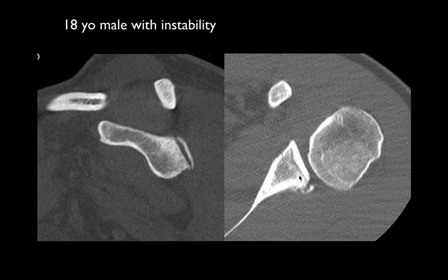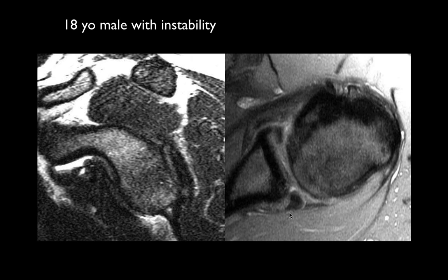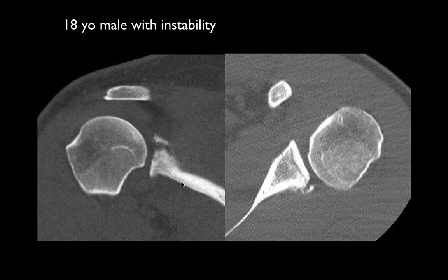So this patient is at high risk for posterior instability, and we're seeing all the changes from the posterior instability. And it just shows how much easier you can see the calcification on the CT. When it's prominent like that, we can infer it on the MR, but it's really hard to actually see the calcification on the MR. You can see it very nicely on the CT.